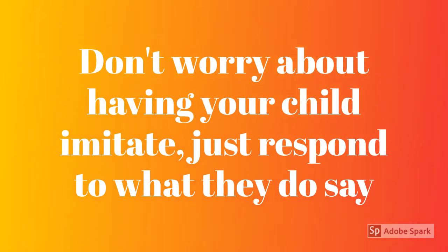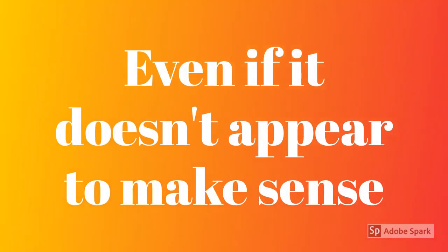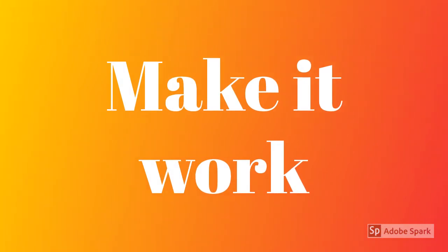Don't worry about having your child imitate a certain message. Just respond to what they want to say. Even if it doesn't appear to make sense, or you know it's not what your child really wants to say. Just respond to what they say the best you can. Make it work. And then model what you think they were trying to say.